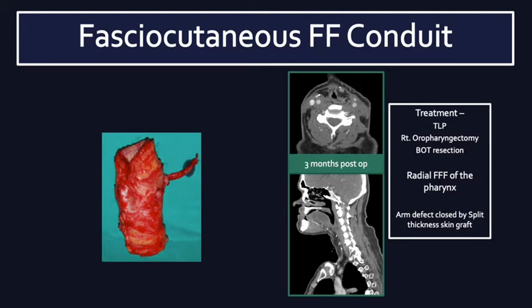3 months post-op, his tubed flap looks like this. You see this subcutaneous flap fat, which is rather scant by comparison to some of the other examples I've shown you. And then the mucosa has been recreated using the skin.